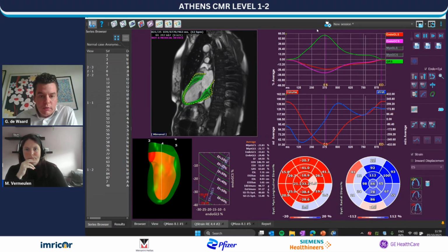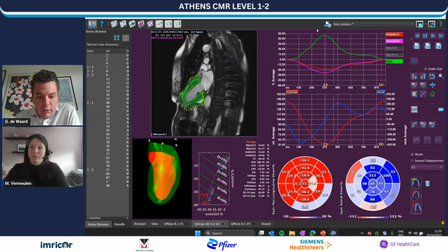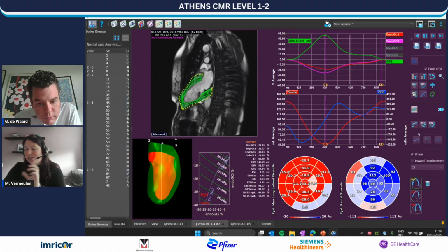You get the atrial strain, or you have to specifically do that, I think, right? The atrial strain, you don't get it automatically. Okay. You can have it automated, but you just have to switch the mode from left ventricle to left atrium. Okay. And maybe let's just highlight here, is that the endo-GLS parameter that you mentioned was the most important in clinical practice? Yep.